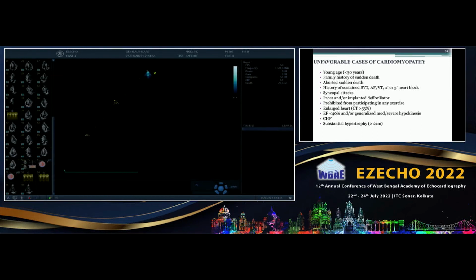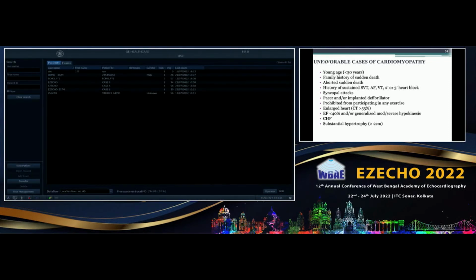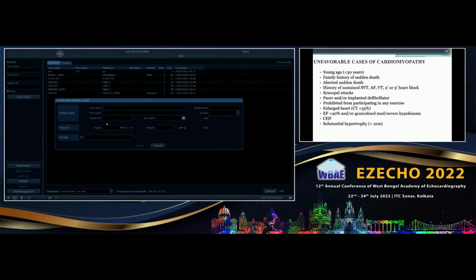So the variegated appearance in GLS. There's a question there, then we'll take it. Sir, as sir told, we get a variegated appearance in GLS in patients with HCM. Are there any other conditions, any mixed pathology? Cardiomyopathy, it need not be. See, what he's trying to tell is when there is a problem in the muscle because of a sarcomeric, inherited problem, you get all the disarray. But in other patients, in aortic stenosis, there will not be so much disarray.